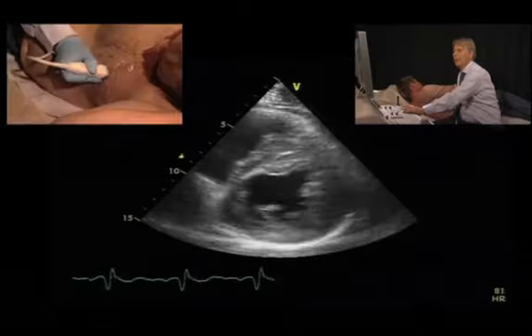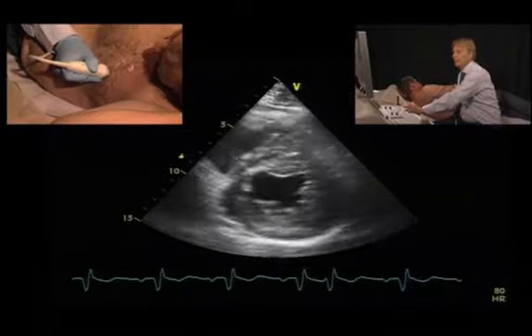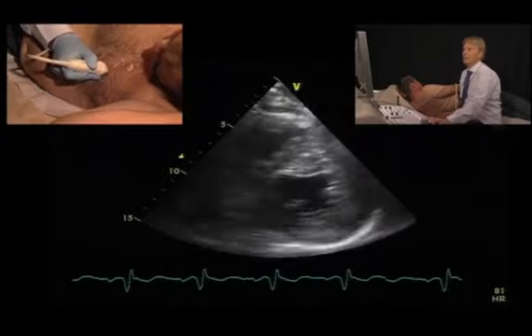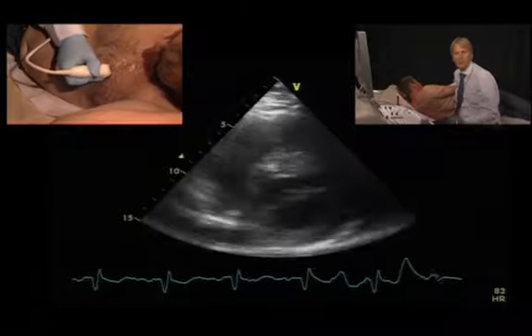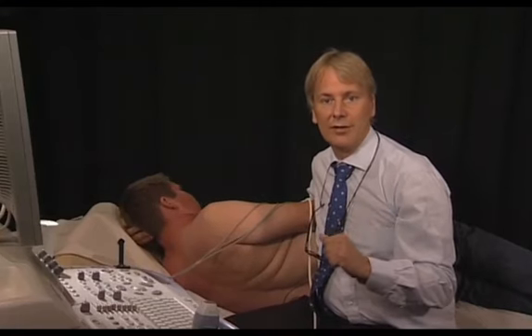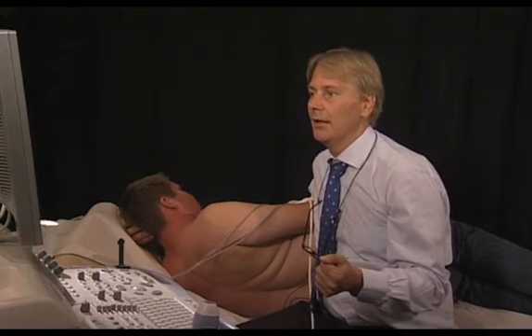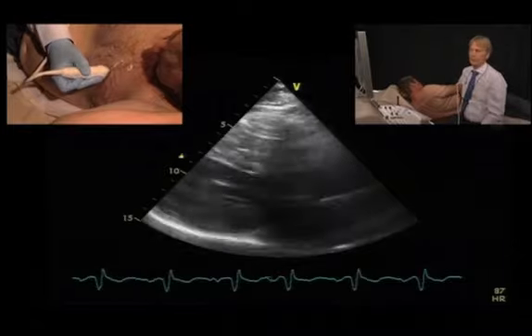And even within the septum you have differences with respect to the thickness of the wall. So this is an asymmetric pattern of left ventricular hypertrophy, which is very indicative of hypertrophic non-obstructive cardiomyopathy as opposed to hypertension, where you can have some degree of differences with respect to the thickness of the wall, but never to that degree. In addition, the speckled appearance of the interventricular septum and the myocardium is also in favor of hypertrophic cardiomyopathy.